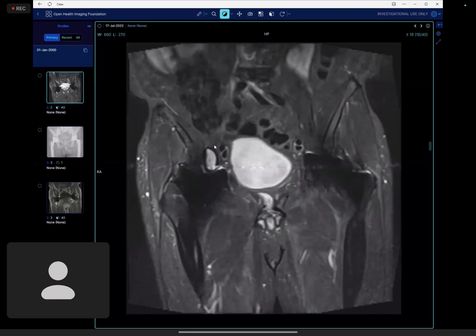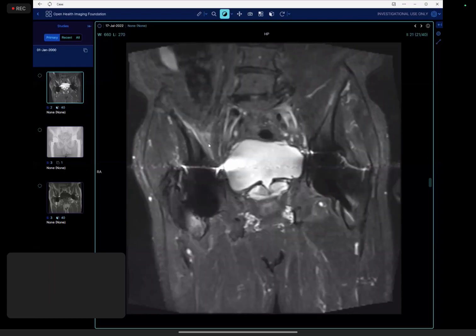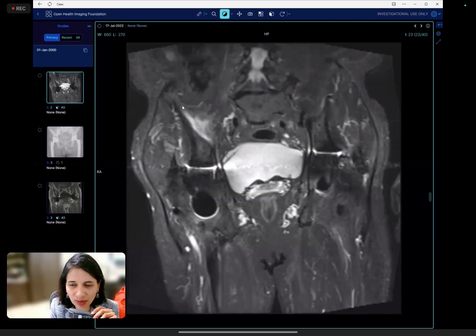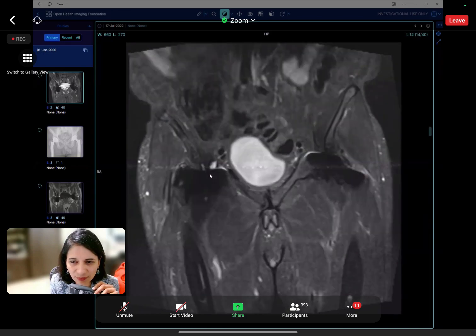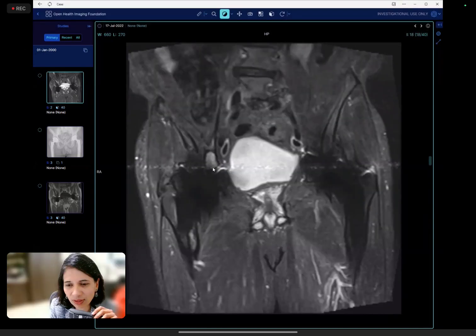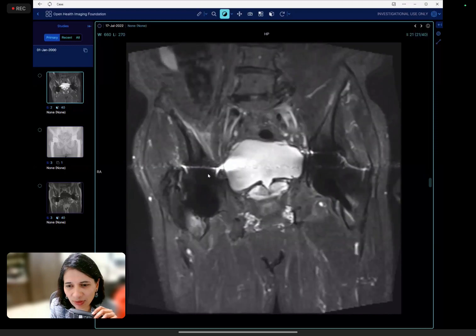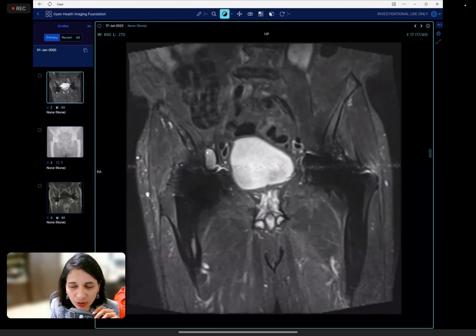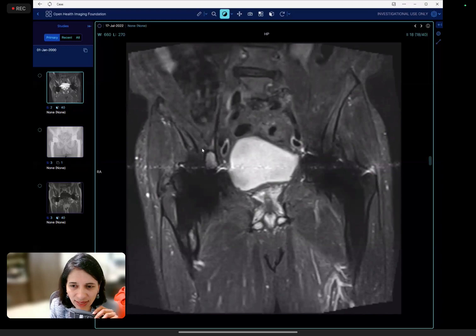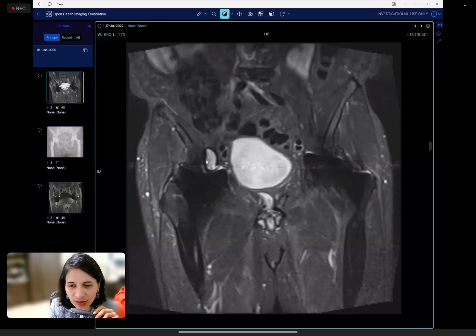Yes. You can see that as well. And if you see, it then continues, with some inflammatory changes in the iliopsoas region. One of the things that you get, as you know, with periprosthetic loosening is pseudotumors, or you can get bursitis and other changes.